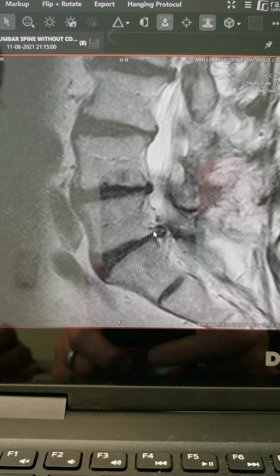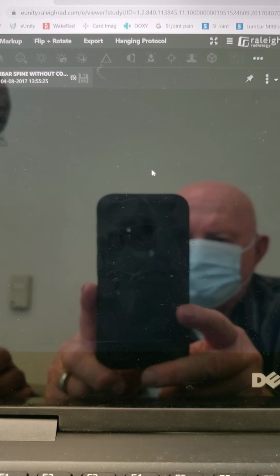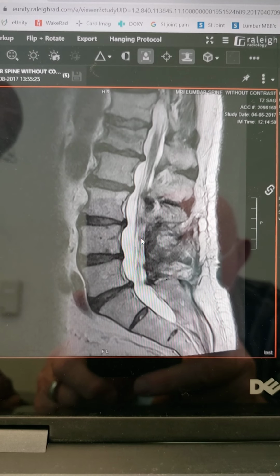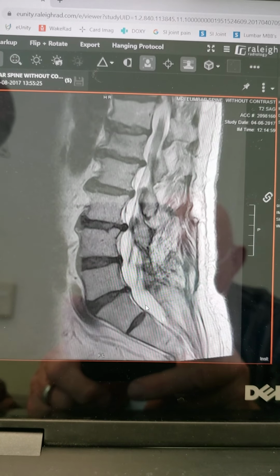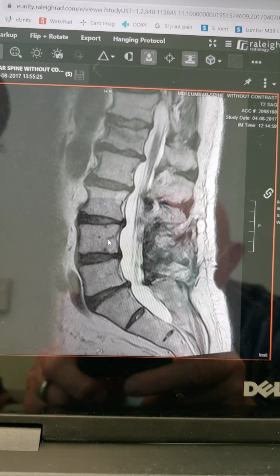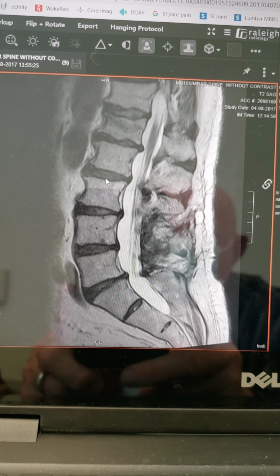Now that's a difference from the previous study that they did on him back in 2017. See the difference from 2017? You're starting on the left, going to the right side, but just through here you pick up pretty much the entire spine in one time. Everything is seen at once. Versus on the other one, when we were scrolling through it, the bottom popped in first, and then the top came in, but then the bottom faded out.